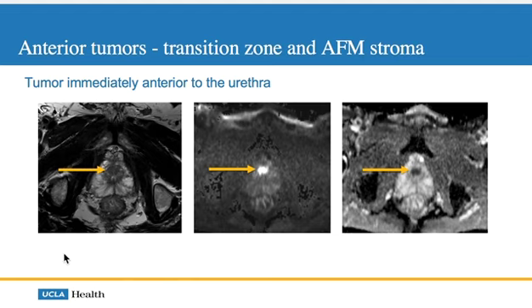This was the same patient in whom we were showing these striated wedge-shaped stripes in the peripheral zone, and we said those are not really consistent with cancer because of their striated nature. The other interesting thing, so I said that when you see these dark things in the peripheral zone, you need to confirm them on your ADC and DWI. So if you look on our DWI in that area of the prostate in the peripheral zone, we really don't see a hyperintensity there. So that, again, is not consistent with prostate cancer. And on your ADC, you don't see a hypointensity there, really.